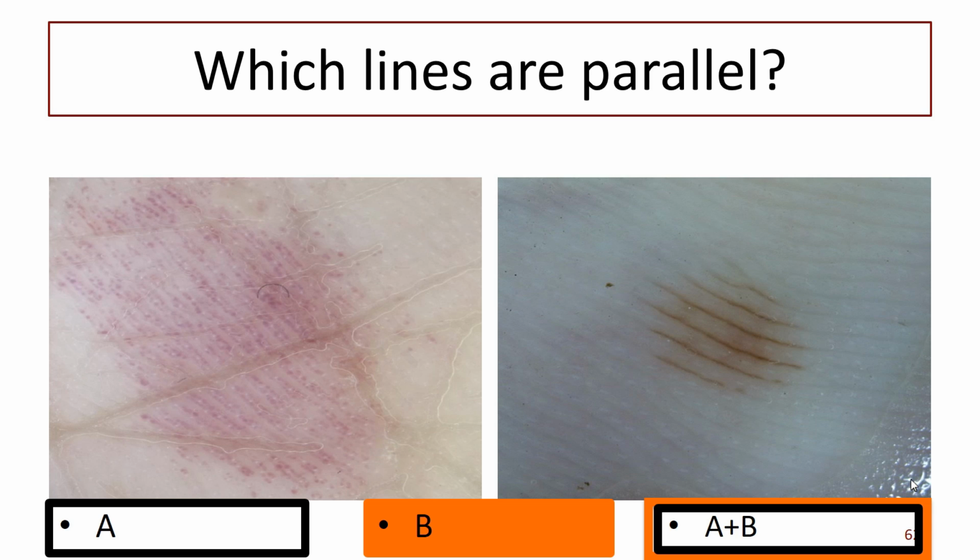Now we learnt from Michael that they might be in the furrows or on the ridges. And do you have any idea whether we're looking, Stephanie, at lines that are in the ridges or in the furrows in this picture?